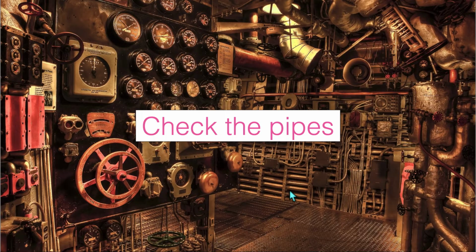And so these last two cases give us the important reminder to carefully check the vasculature on every case for venous or arterial thrombosis as the cause of abnormal bowel thickening.